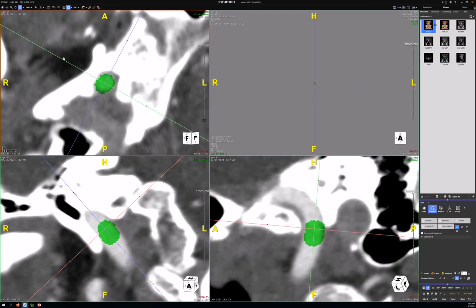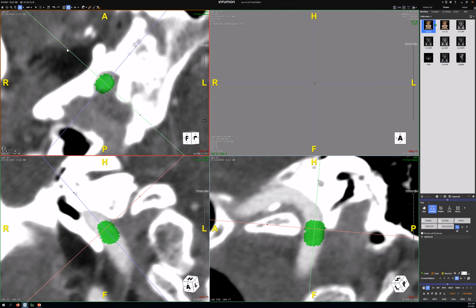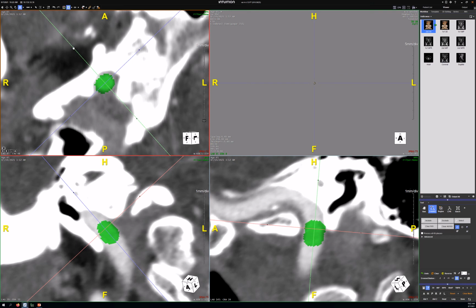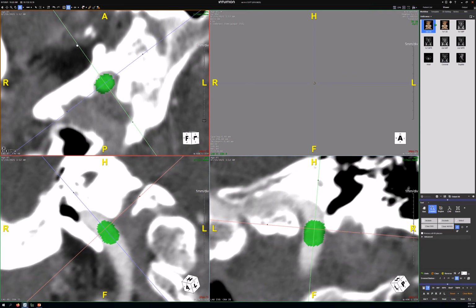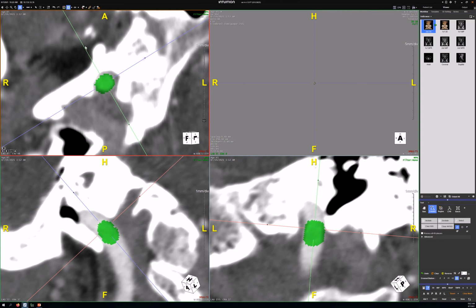Just want to go back and forth and see. There's a missing voxel right there. Okay, so we'll stop this video, and then I want you to do it, and then we'll come back after you've gone and done one example, and then I will fix it and talk through fixing it because there'll be issues.